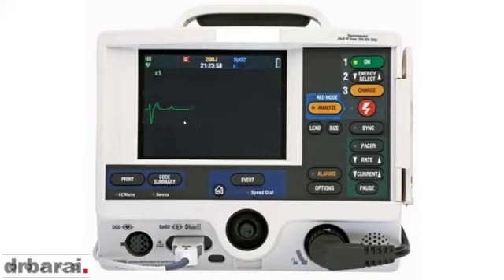Now, if you carefully look at it, the PR interval is irregular. The PP interval is pretty regular. So the SA node is producing cardiac impulses in a regular way. And if you carefully look at it, the RR interval is also regular. So the ventricular depolarization is happening at a regular interval as well. However, there is no relationship between the atrial activity and the ventricular activity, because the PR interval is not constant.